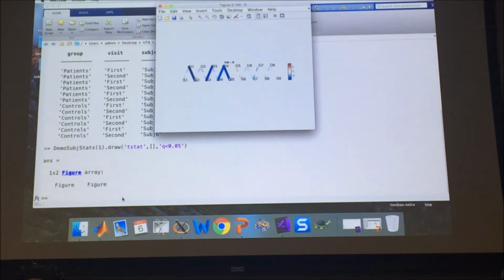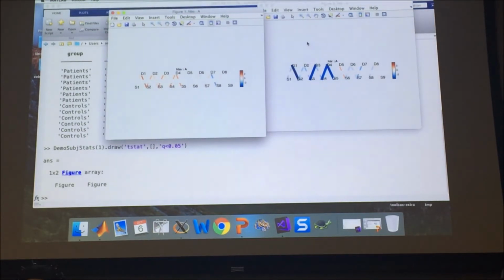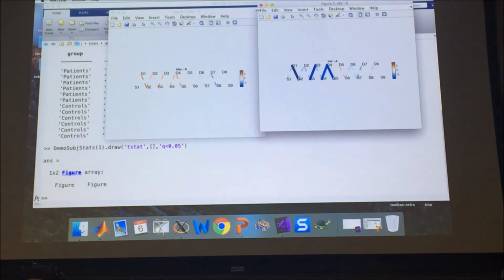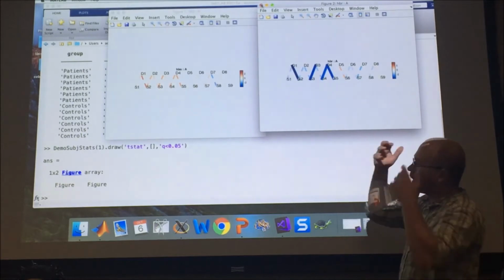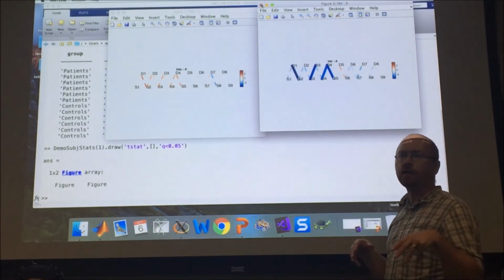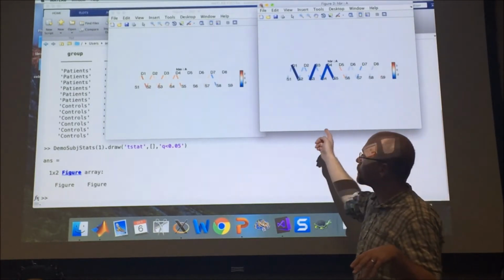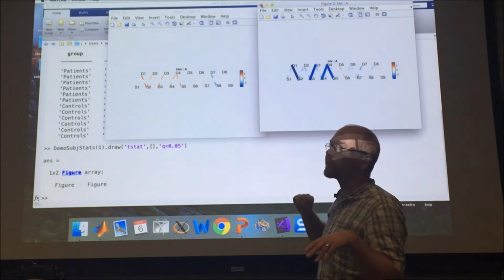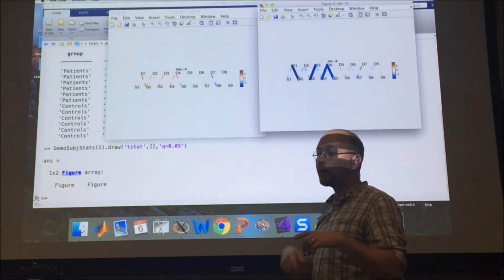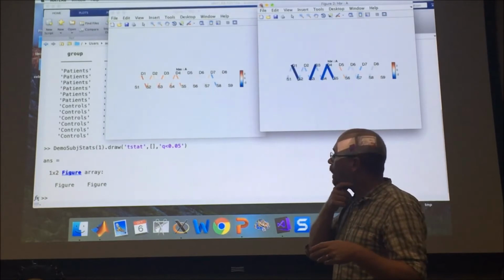this is actually kind of simulated data. That's not a great one, but this is basically a forehead type probe. It's actually a kind of weak effect. If I look at any one subject, I'm marginally making statistical significance, maybe in some of the cases, depending on which file I look at. When I look at the group average, I'm going to have a lot better resolution.